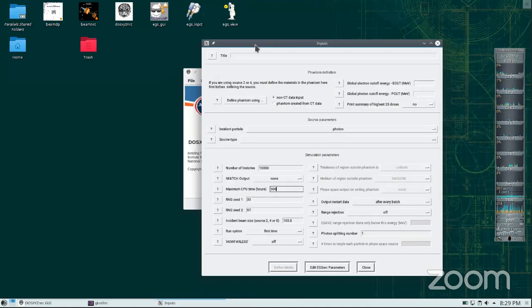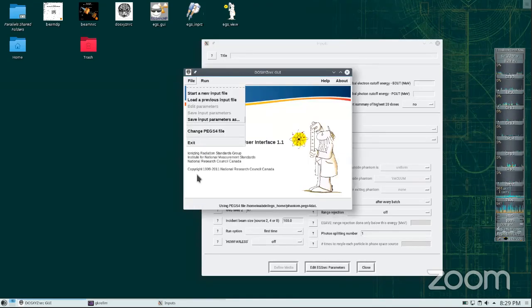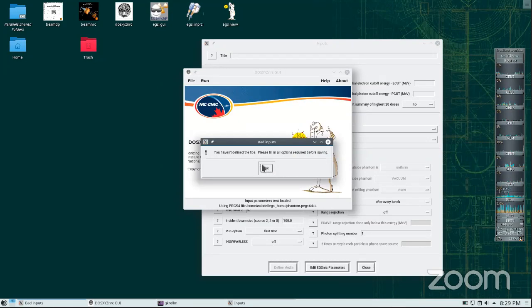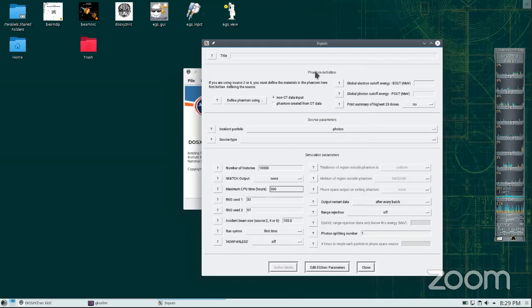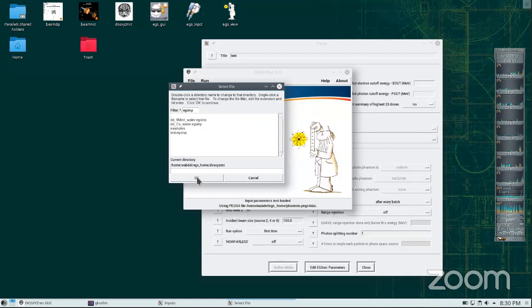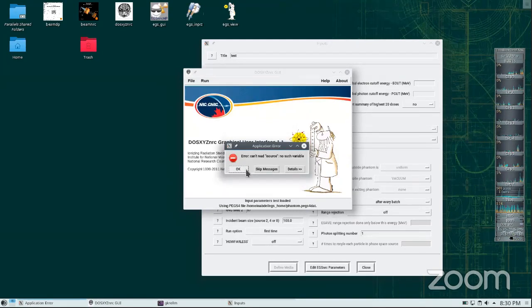Then let's save. Yeah, let's save it. We'll do this as test. It's complaining I don't have a title, so put test, and then let's save it.